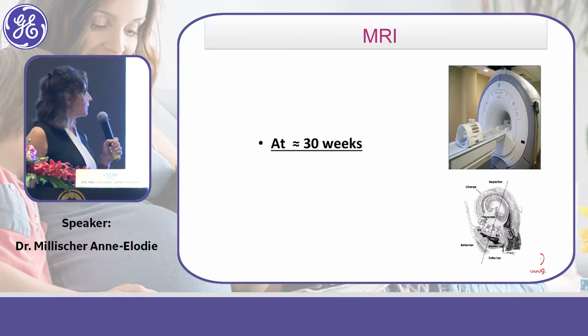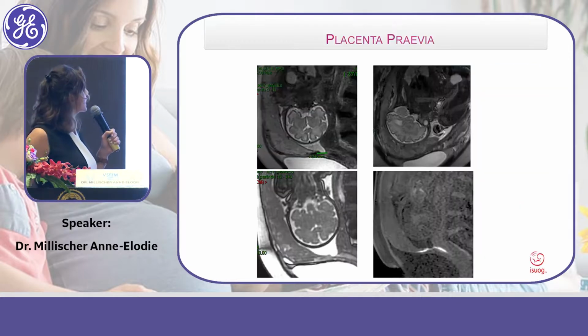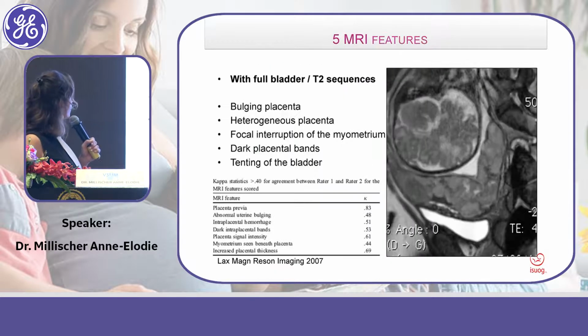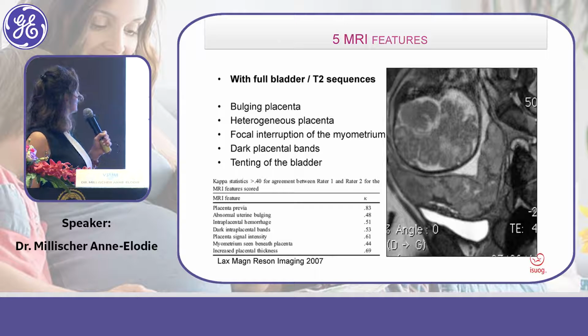We'll go through rapidly with MRI just to know the aspect that it can show. The placenta previa is correctly diagnosed with a very reliable measurement of the location of the placenta and the internal orifice. Và bây giờ mình sẽ khảo sát bánh nhau trên cái hình ảnh MRI. Thì cái hình ảnh hồi nãy cô cho thấy là cái bờ bánh nhau nó cách cái lỗ trong khá là gần. We have this quite parallel semiology of the diagnosis of placenta in MRI.